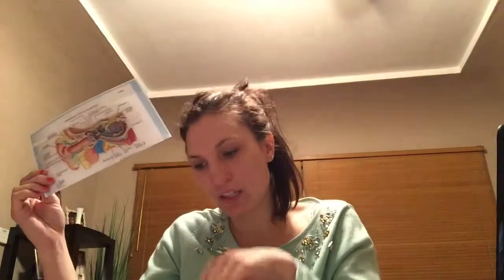So next, we're going to look at, first I'm just going to tell you what an audiogram is, and then we'll look at Mari's. So here is his audiogram. An audiogram is a chart in which the audiologist records the results of the hearing test.